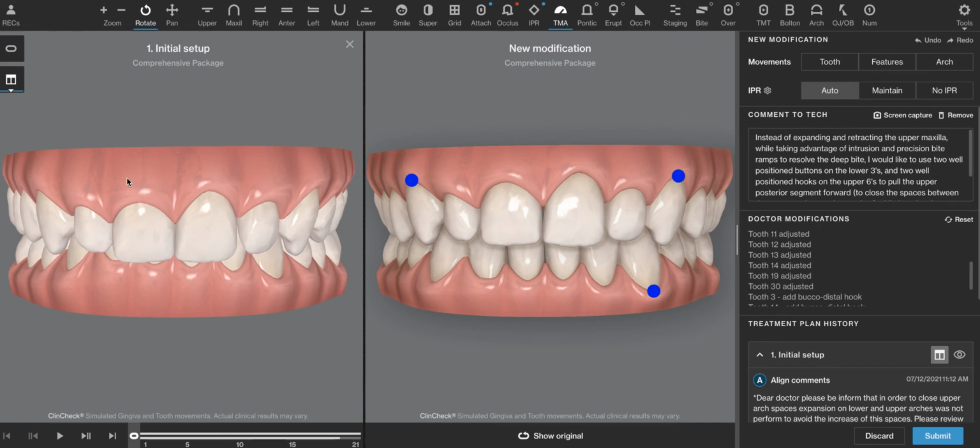I wouldn't worry too much about doing bone sounding here to determine the biologic width apparatus. We can assume that that is tissue there. I would look at a radiograph and just make sure that the CEJs of the two teeth are lined up. If they are, you can make the assumption that that can be removed with a laser or an electrosurge without rebound. But there are situations where this tooth will erupt, and for whatever reason, the incisal edge of the tooth wears, and the bone and the CEJ of this tooth are actually incisally placed compared to the adjacent tooth. That's a situation where you need to do bone sounding and determine whether or not you can reduce tissue without doing bony reduction or crown lengthening.